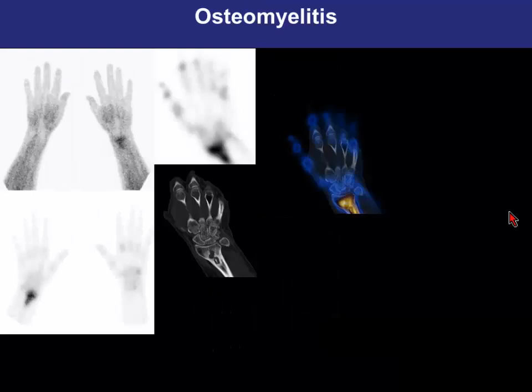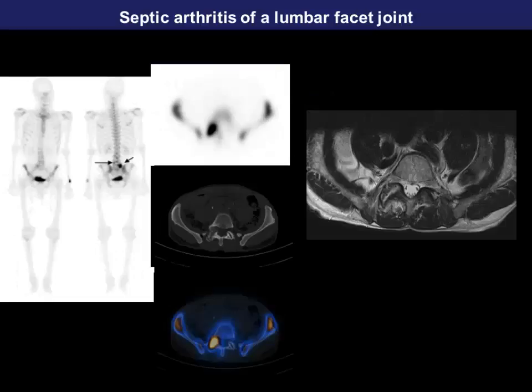Another patient, in this case it is a straightforward one, but the only thing is you get a better anatomical delineation using the CT component, where there is quite a lot of destruction, sclerosis, increased vascularity, and increased uptake in a patient suspected of osteomyelitis. Without the SPECT-CT, I could have said this is osteomyelitis, but for a better delineation of exactly how much is involved, it's better to do the SPECT-CT and say whether it's a proximal or the whole third, upper third or upper half, and all sorts of things. We can give a definite anatomical correlation, and that's where SPECT-CT helped in this patient.